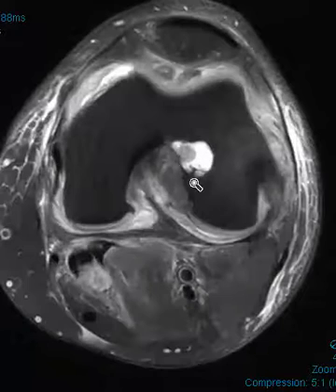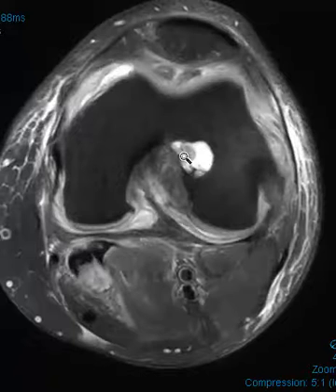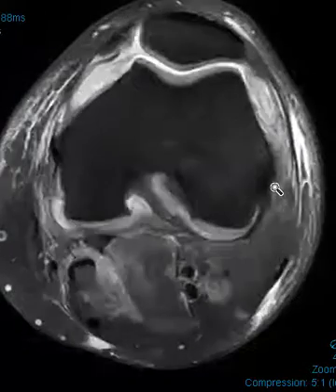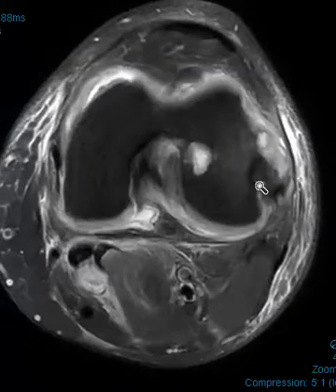This is a cystic erosion here. The ACL is diffusely thickened, and there's this erosion of the intercondylar notch adjacent to that. A little mound of something in there, a little gray tissue within that bone cyst. Also over here we can see the popliteus tendon. Usually it looks normal, but here it looks too thick and too gray. So we're going to look at that on another view here.